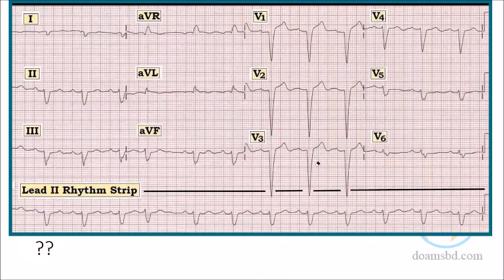So what is Ankit saying? Sir, left bundle branch or right bundle branch block? Dr. Karishma also, please. Left. Any query in your mind? Sir, the rhythm is also not regular. I'm not asking about the rhythm, doctor. We are discussing the block. Try to identify the block. Maybe regular, maybe irregular, not the matter. If you see the long lead 2, it is not regular. This is true. But I am asking about the block: which block? Right block or left block?